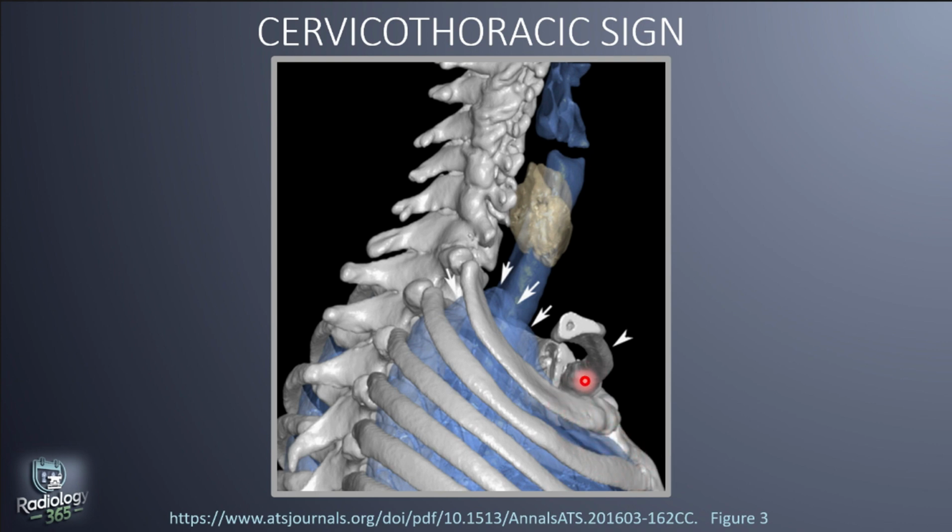However, if you have an anterior mediastinal lesion growing very large, it's unlikely to extend above the level of the clavicles, because as it extends upwards, it reaches the level of the clavicles, the first rib, and then all the soft tissue in the neck would give a lot of resistance. And so if you have an anterior lesion that appears to cross the clavicle, it's very likely to be coming from top down and not down up.